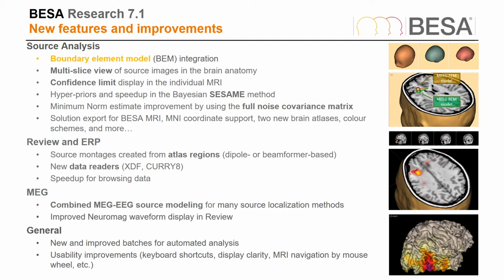We will particularly look at the boundary element model integration, confidence limit display in the individual MRI, multi-slice view of source images, combined MEG-EEG source modeling, improvements in the Bayesian Sesame method, and finally creating source montages from atlas regions.